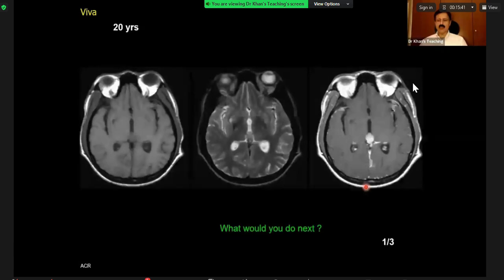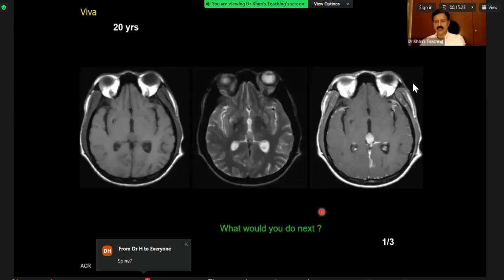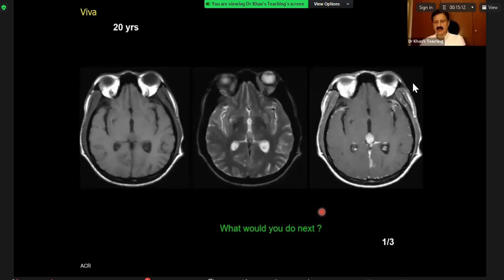Yeah. So the point is that the same part of anatomy, this is the third ventricle, and there is a mass here. What would you like to do next? I'd like to know if there's any calcifications, if this patient's had a previous CT scan. No calcification. Anything else? And I test the patient for serum or CSF biomarkers of hormonally active tumors. Any imaging you want to do or see?